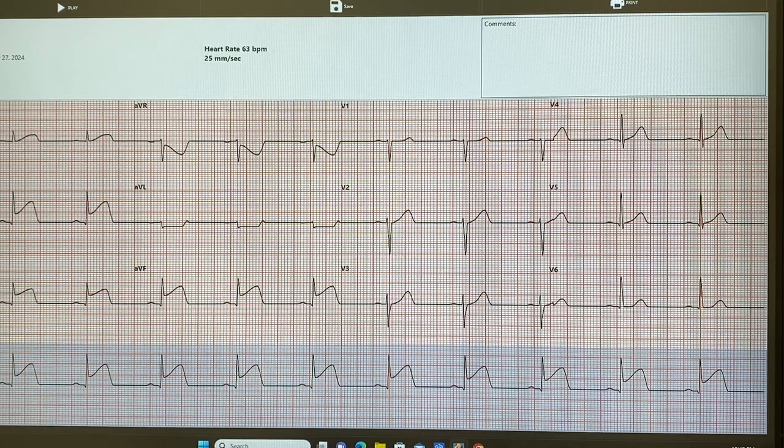Continue. Now I'm looking at the P waves. Whether they're present. Yes, and I do see P waves. They appear normal. Okay, very good. And I see a P wave for every QRS. Excellent. So no irregularity. Next, we can say that it's not an atrial problem.